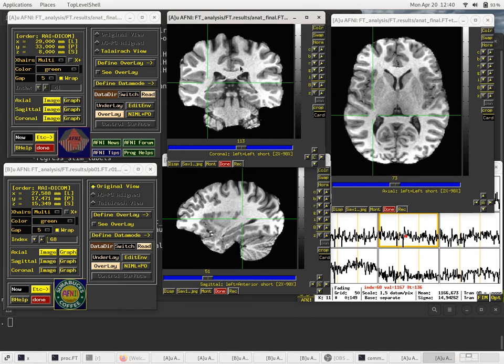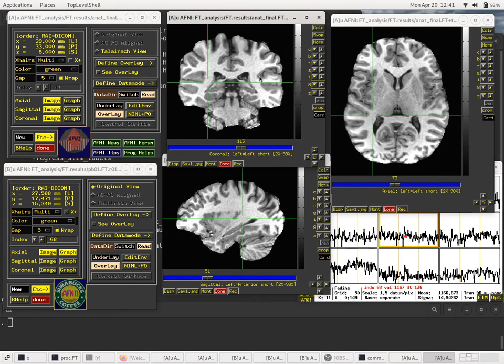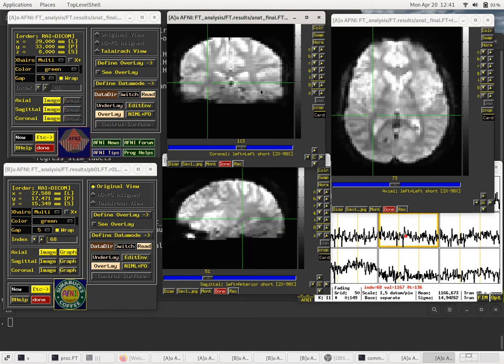These outer regions are a little harder to detect. Well, this should be one blob and this two blobs, but even these two blobs might kind of match those two, so that's a little harder to tell there. But anyway, this looks great. Looking at each one of the four of these, you can actually see the registration looks fantastic.